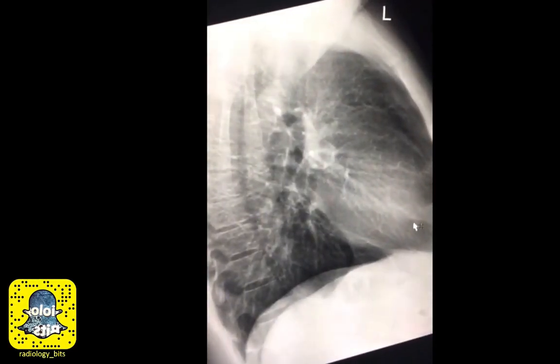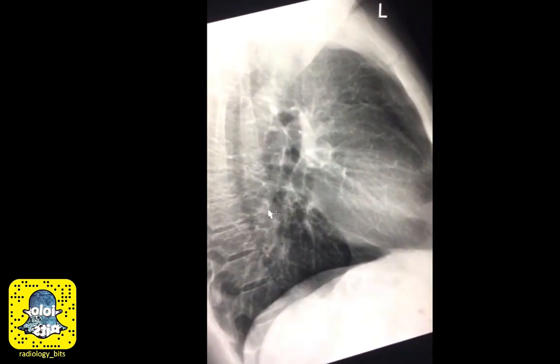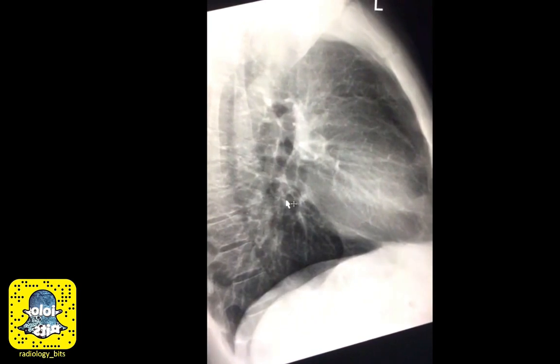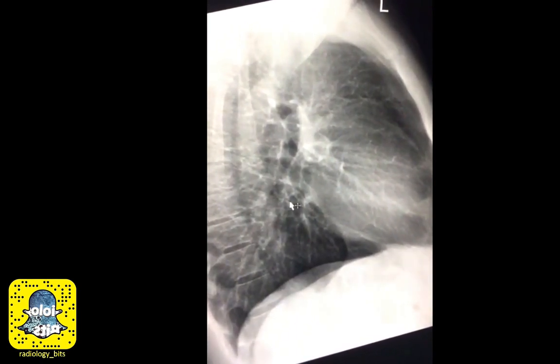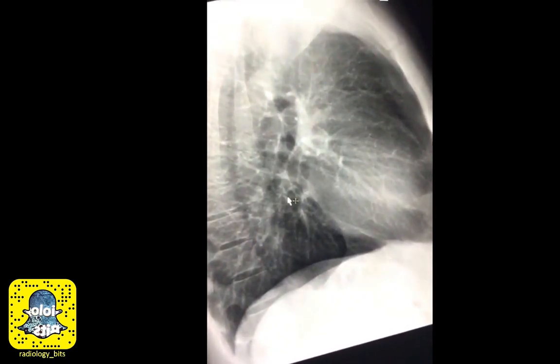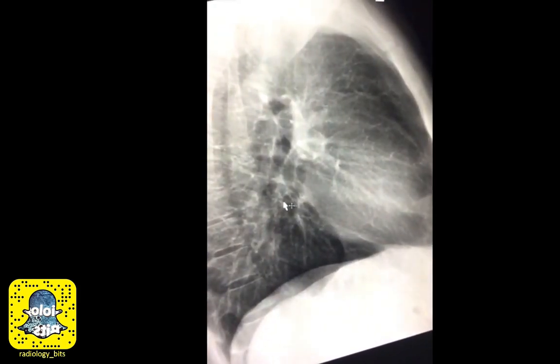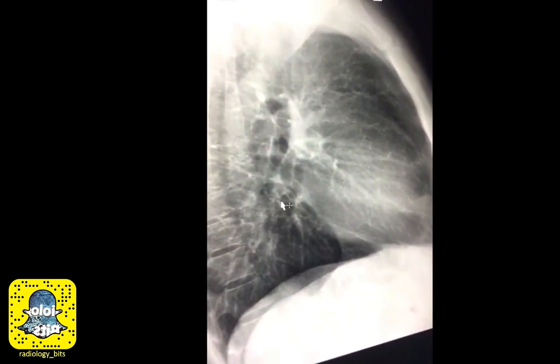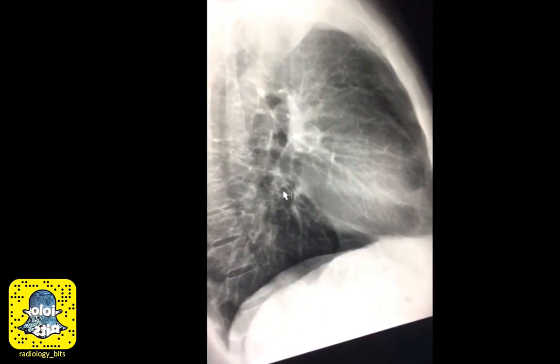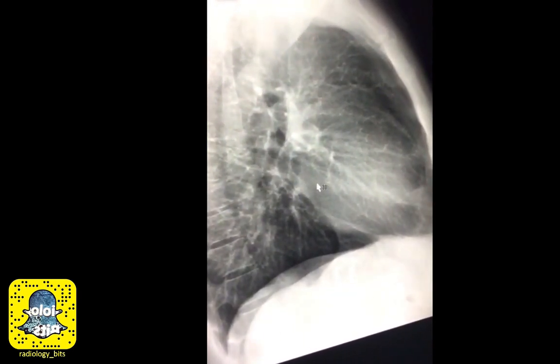Now let's go to the lateral chest radiograph. What we're going to try to identify here is how to differentiate anterior from middle from posterior mediastinal compartments. This is a confusing part for many people who start reading about this because it's written in different ways in different textbooks. A big reason for that is that there are several radiographic classifications. Another reason is that the radiological literature is different in the way it classifies those compared to the surgical literature. I'll give you a simple approach that I like to use, but you're free to read about the others in textbooks.